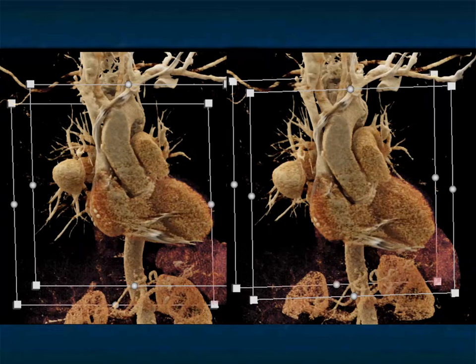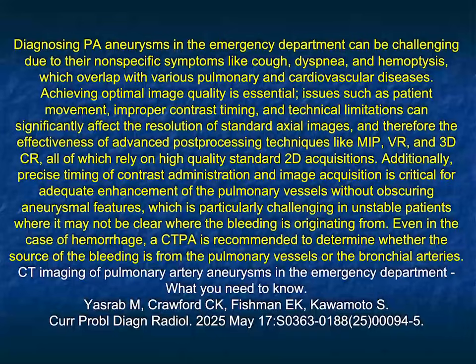Remember, we can have pseudoaneurysms which occur secondary to lung tumor, but when you see things that look like a mass, you always think about tumor first because that's much more logical and much more frequent. But when something is very round, you've got to think about vascular structures. And if you did a non-contrast CT, do a study with contrast before you do any intervention. Make sure you're not dealing with pseudoaneurysms.